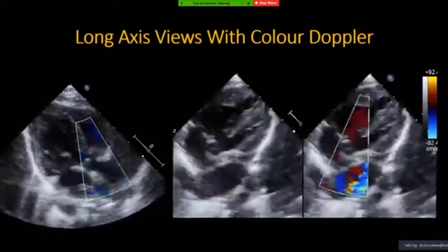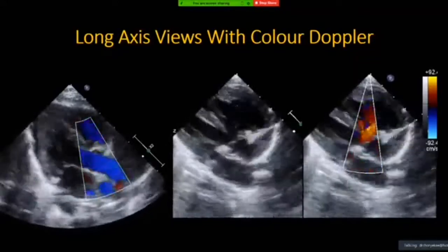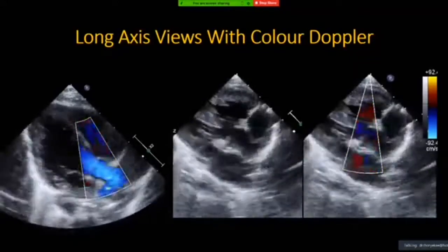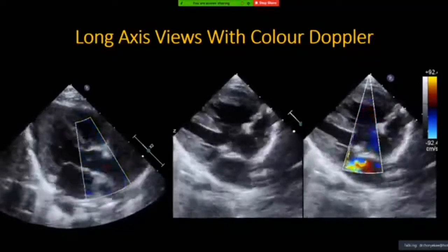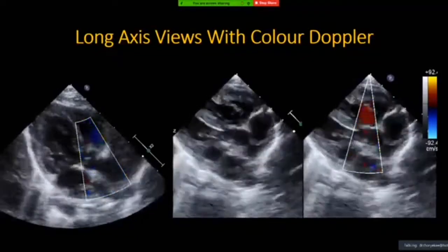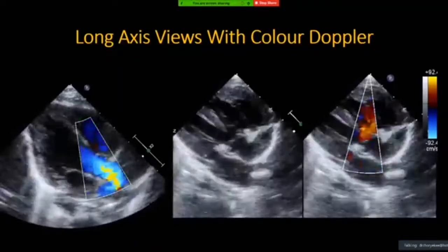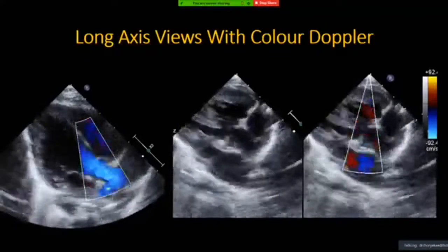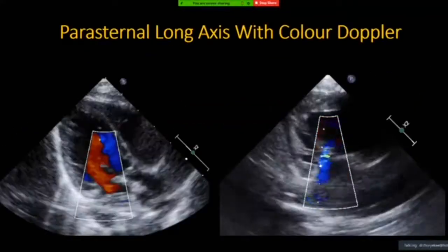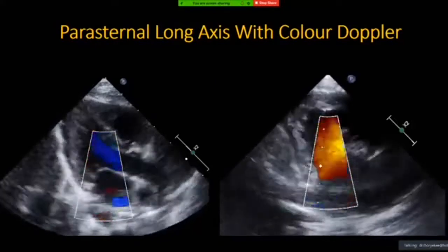This heart looks very abnormal because its shape and position are out of the usual normal pattern. Hence, you could subsequently refer to the cardiologist to further investigate, and not rush into treating the desaturation. Okay, I think this is the last one.